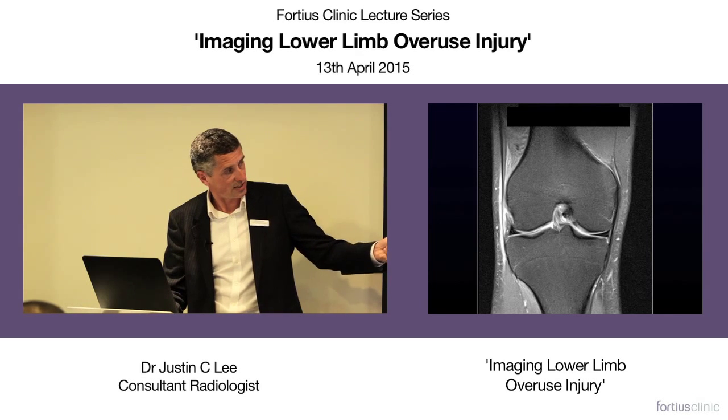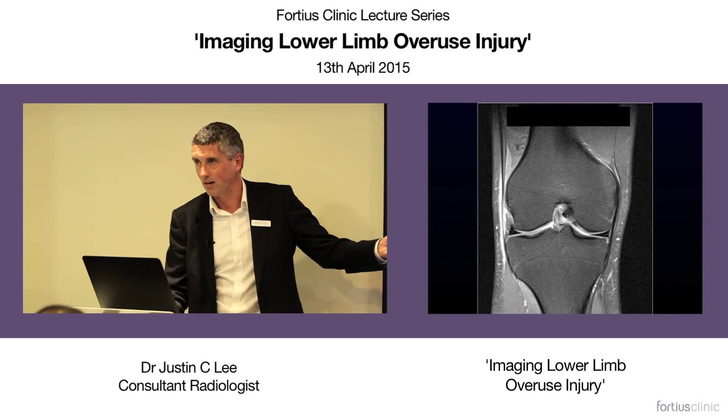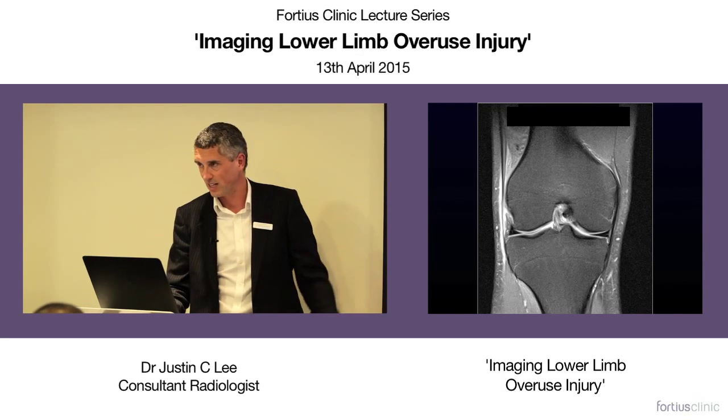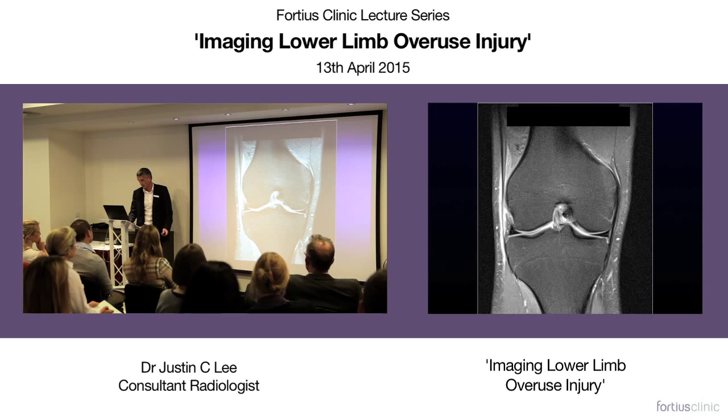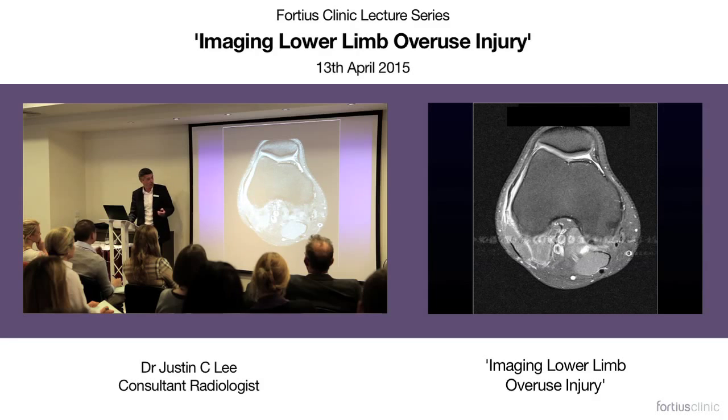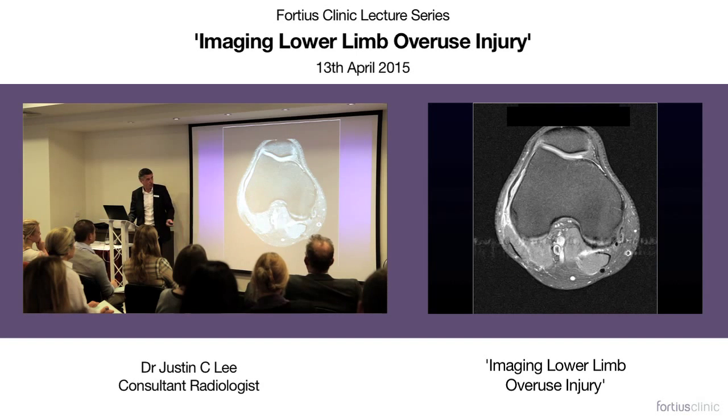The inflammation is there. The severe cases, they get it up there, but the really severe cases get it on the superficial surface. I mean, that's unusual. But this guy, he's not got much body fat, so he's obviously really gone for it on his marathon training. But to get the inflammation superficial, you're really talking about somebody who's really gone for it.